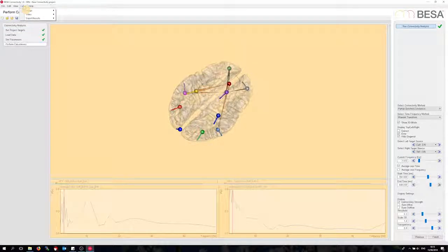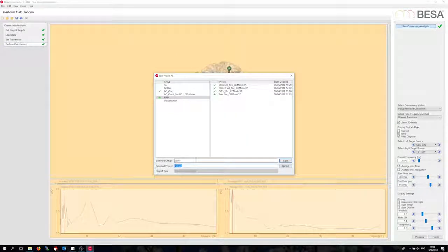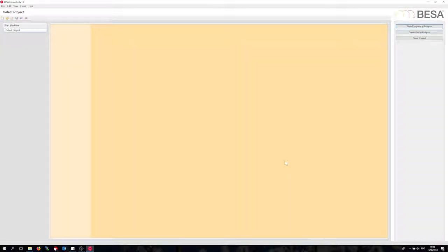I can export these results as connectivity data to ASCII files to import later into MATLAB or other packages. Now let me finish this project and save so I can reload the results at any point in time later. This concludes this video session, where we explored different time-frequency methods applied to several connectivity methods for 2 different conditions all in one go. Thank you.